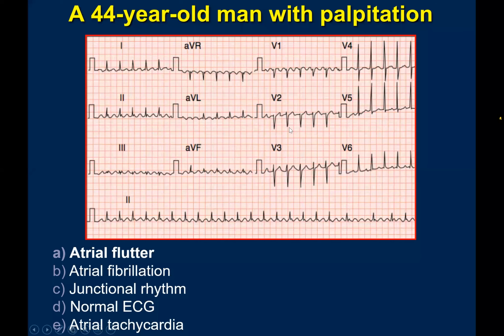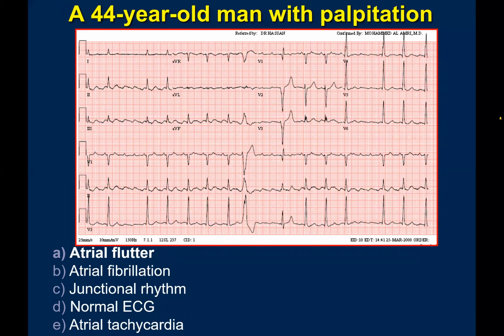Sorry, just to make sure, you see the same, this is the ECG you mean, or you don't see it now? No, I cannot see it. The one before it. This one? Unfortunately, still I cannot see it. No, I did not show. Yeah, this one, yes, this one. Sometimes it takes a few seconds to show it. So what was the question, please? The lead 2, the strip rhythm, the last 4 beats are different from the chest lead. Specifically, I mean V5 and V6. I cannot see the P wave and the QRS are not in.